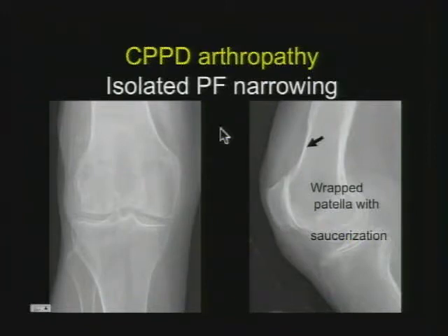But what we also have is this little smooth indentation above the patellofemoral joint, and what that means is saucerization, and that's usually when you have a very tight joint, and it's from CPPD crystal deposition disease. Pretty much that's the answer here for this type of a case. In my own practice, I see it all the time. And the classic thing would be to spare the medial and lateral compartment and just have patellofemoral involvement, even without seeing calcification. Notice we do see calcification in the menisci.